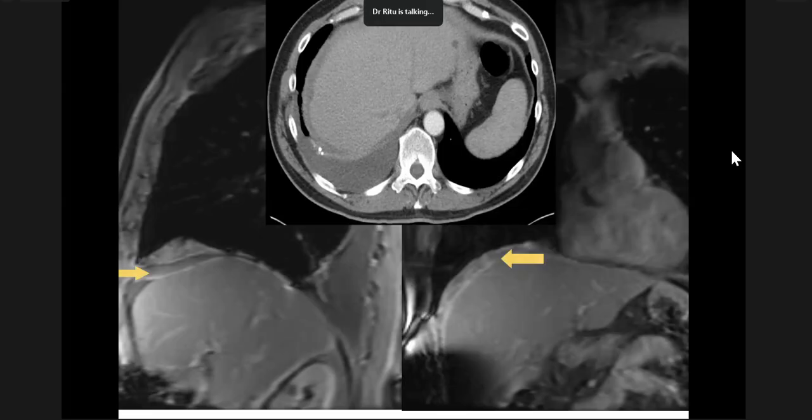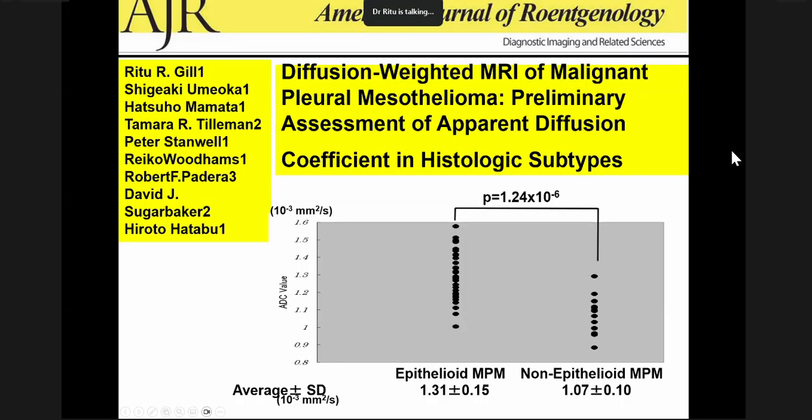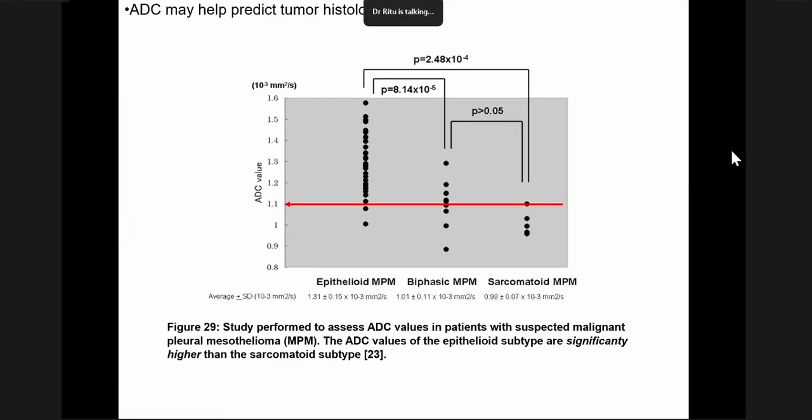And so what I recommend for radiologists is to be descriptive in these patients and detail out where all the invasion is, unless and until there is transdiaphragmatic extension, as in this case, which is definitely not resectable. In the interest of time, I'm going to move along.